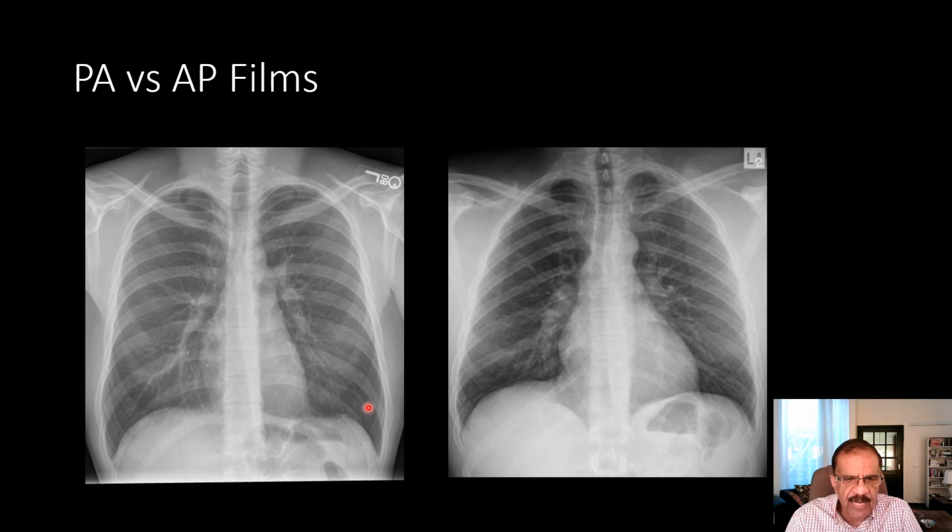Now, this is, for example, air. This is shown black. Now, this is outside the chest. This is jet black. So you would see various grades of gray, from absolute white to maybe jet black here, and that actually determines the density of the structure. A computer can determine more shades, but the human eye can only appreciate, I think, about 16 different grades of gray shade.